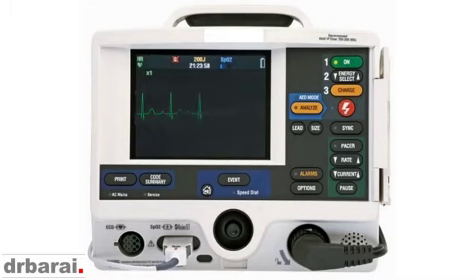Now, what is happening here? If you carefully look at it, sinus rhythm, P wave followed by a QRS complex, P wave followed by a QRS complex, but there is one P wave which is not followed by a QRS complex. So there is a dropped beat. This is an atrioventricular block.